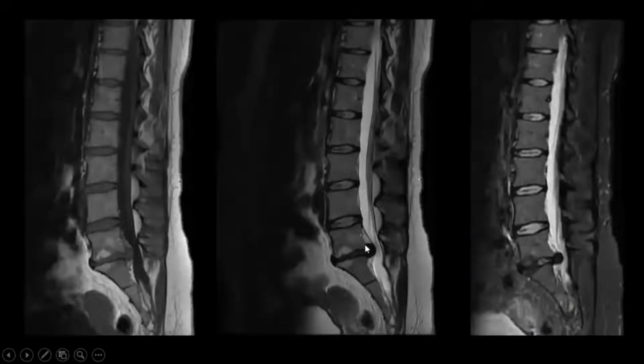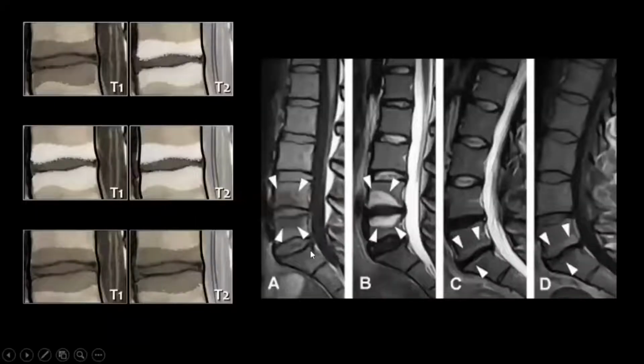So we can see the T2 sagittal image. There is a focal disc protrusion and it is uplifting the posterior longitudinal ligament. Interestingly, you have Modic changes at the disc. These changes are hyperintense on T1 and hyperintense on T2, being suppressed on STIR images, and therefore we know that these are fatty changes. So we have Modic 1, 2, and 3 disc end plate changes, and these are based on the degree of chronicity.